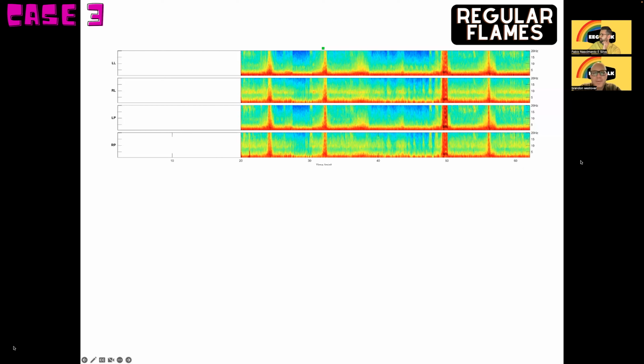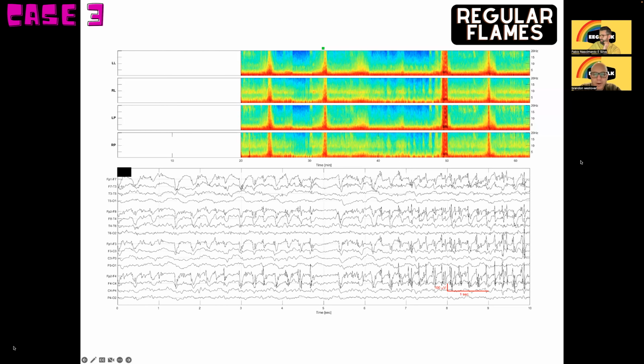Should we look at the answer? Let's do it. By the green square. So yeah, we're in the middle. We're at the beginning of a seizure. Yeah. Perfect. Cool. Got it. Sweet. Next. Another one.